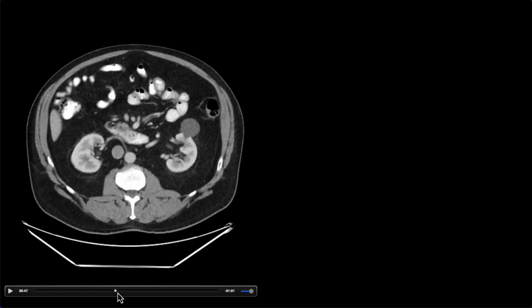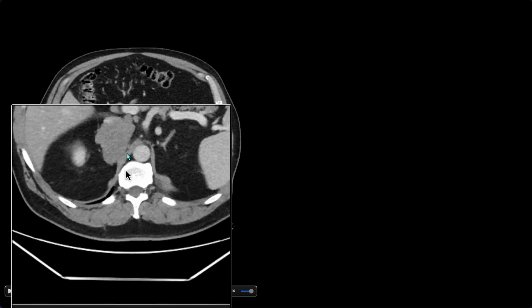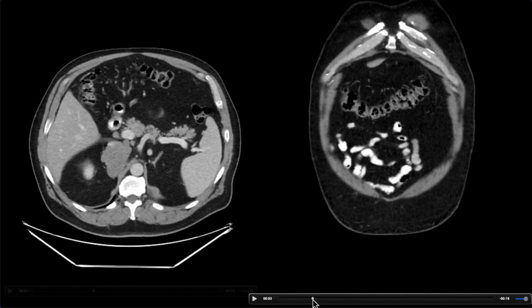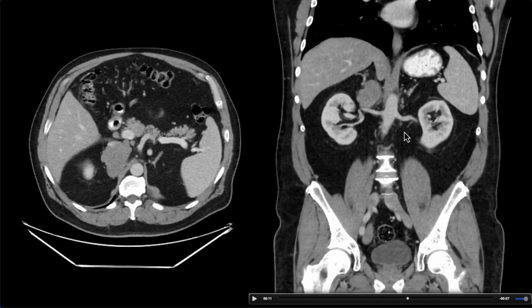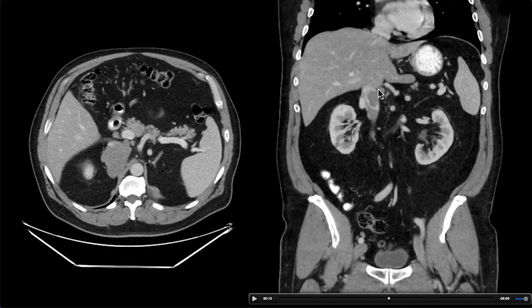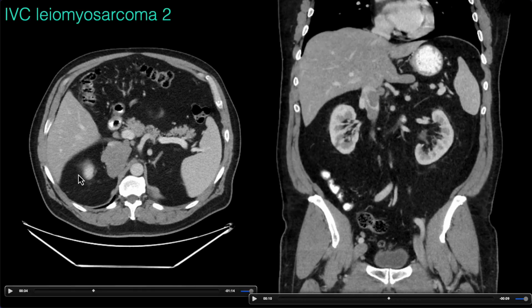The right kidney also appears to be distinct from the mass, but the IVC, as we follow it up, looks like that's primarily forming the epicenter of the mass. And it has that kind of lobulated component along the posterior margin of it, and then it meets up and infiltrates into a portion of the lumen here. So this is just another example, biopsy-proven IVC leiomyosarcoma.